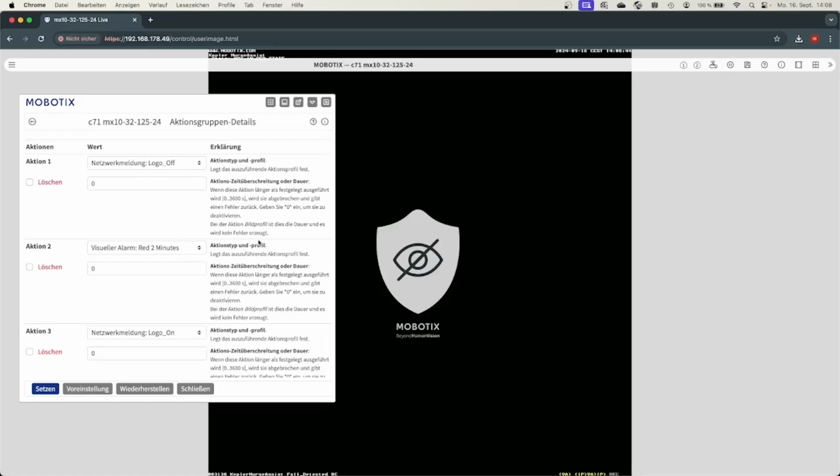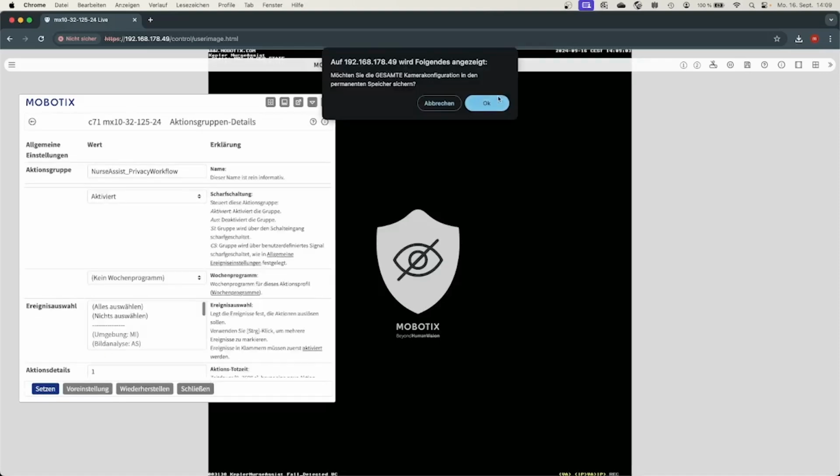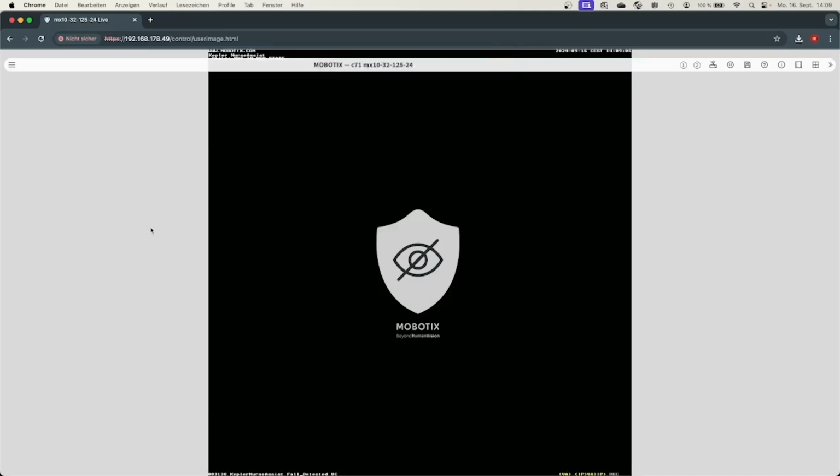Those are by default the actions you have in the camera, but you can add more actions, like doing a SIP call to somebody on the cordless phone. That is also possible. So more options are available that you can configure. For demonstration purposes, we enable the signal user click to demonstrate how that whole mechanism works.